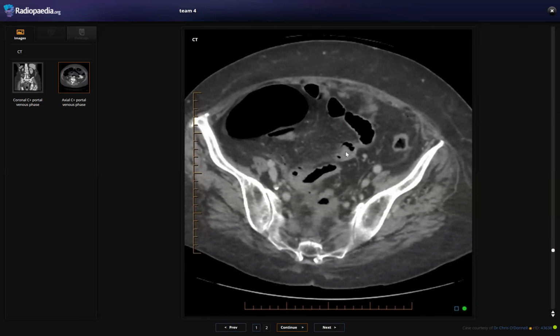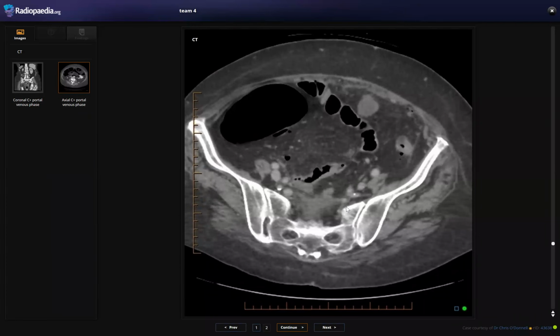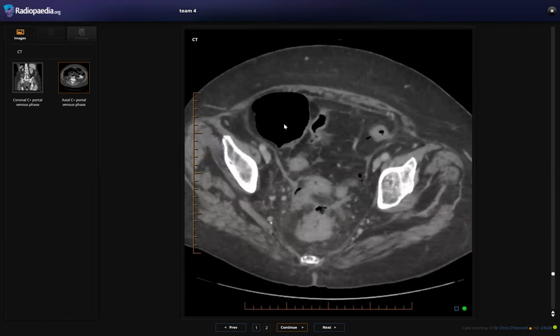What else? Can you give me the summary? The diagnosis totally? Okay. There is evidence of sigmoid colon wall thickening, which most likely can be cancer with peritoneal metastasis and hepatic metastasis, and there is evidence of pneumoperitoneum, maybe related to rupture of one of the sigmoid diverticuli as well. Differential can be sigmoid diverticulitis, but actually this is an irregular thickening, and the presence of peritoneal and liver metastasis is more in favor of malignancy. Yes.